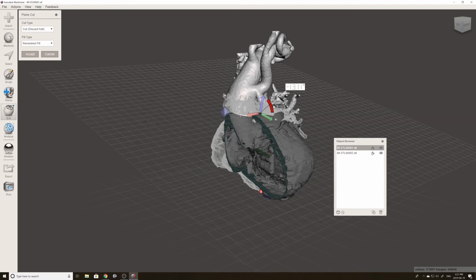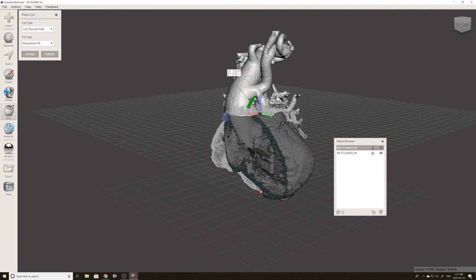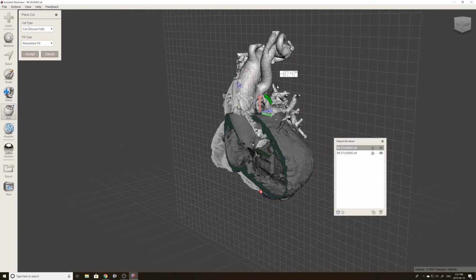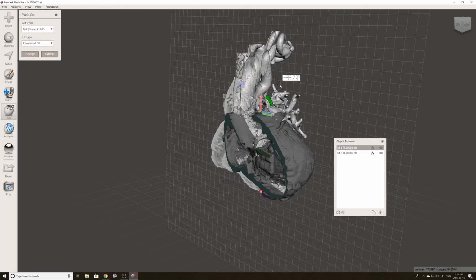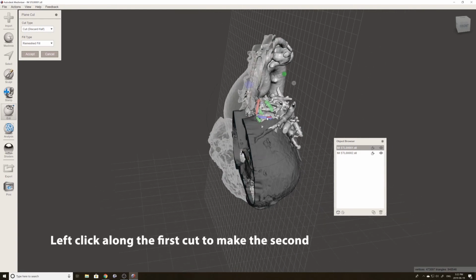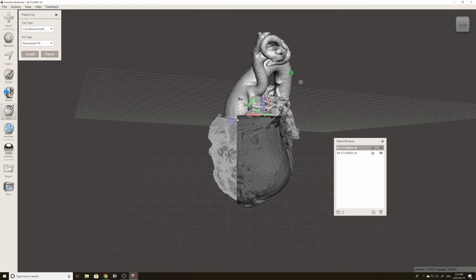and working on that plane cut. Originally I thought I could rotate it to fit, but we'll see here in a second that using the clicks for the plane cut, so just doing 2 clicks with the left click, I can then align it right with where I want the cut to be.